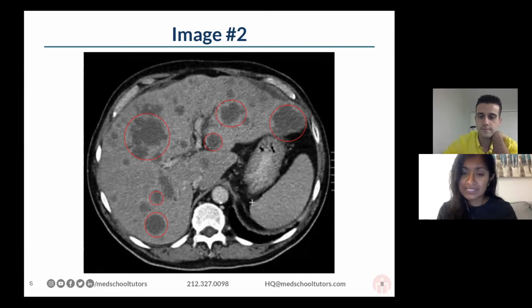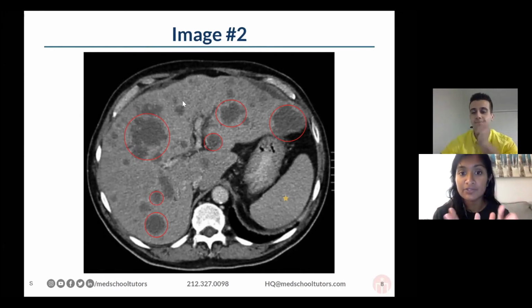Then also I can see bottom right, I see another smooth organ in the left lower or left upper quadrant, most likely the spleen. And then in between those two, you can sort of see the stomach. So again, just big, broad strokes. And honestly, even if you don't see the stomach, even if you don't see the spleen, doesn't matter. You see the big liver.